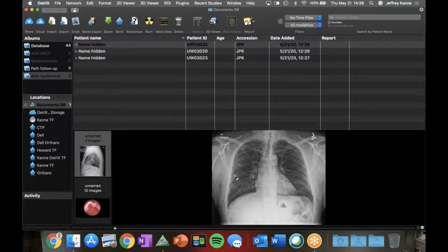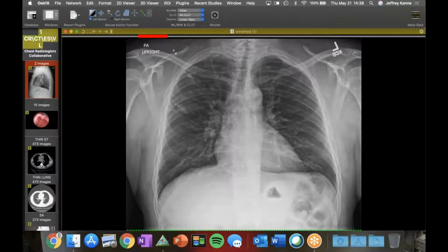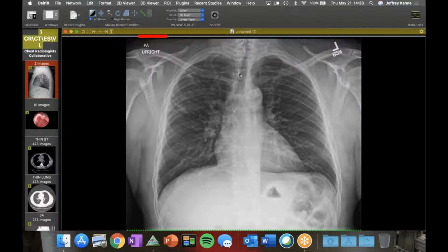So this is a middle-aged patient with chronic disease, and a couple of things on the radiograph. You can see some ill-defined nodules here. They look pretty dense, so they may be calcified, but I want to draw your attention to the trachea, and it's quite narrowed just above the thoracic inlet here. It's narrowing the trachea, maybe a little bit of wall thickening there.